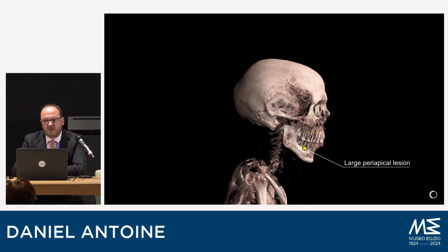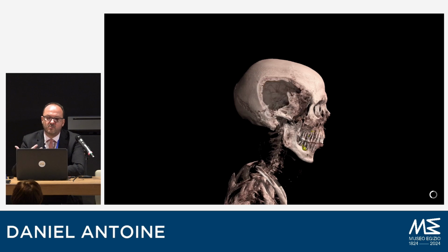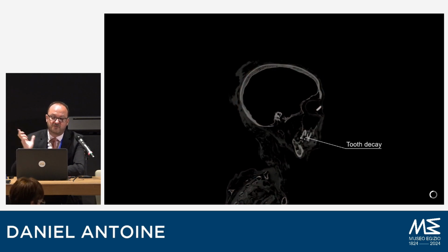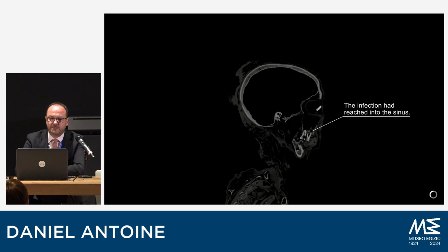And we're using different combinations now and new approaches. We're mixing the original data with the three-dimensional modeling here, because the original data gives, as we've just done here, greater contrast, allowing us to communicate this more effectively with the public.